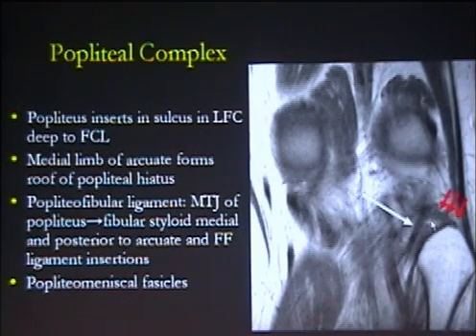All right, so what are we looking for, actually? We're going to look for this. This is the popliteus tendon, okay? You can actually see the structure. All these structures back here you can find if you're looking for them and know where to look, except the arcuate, I think, is very, very difficult. This is the popliteus tendon, okay?